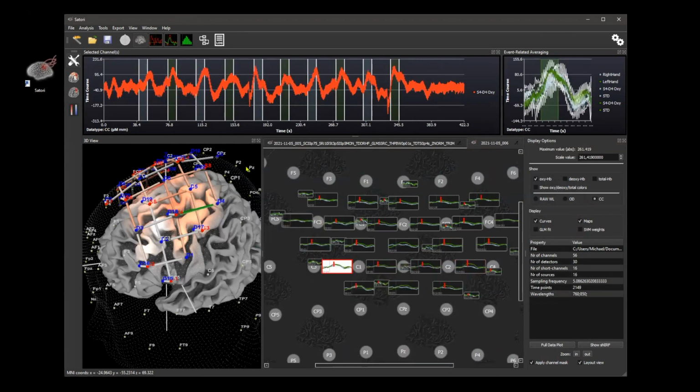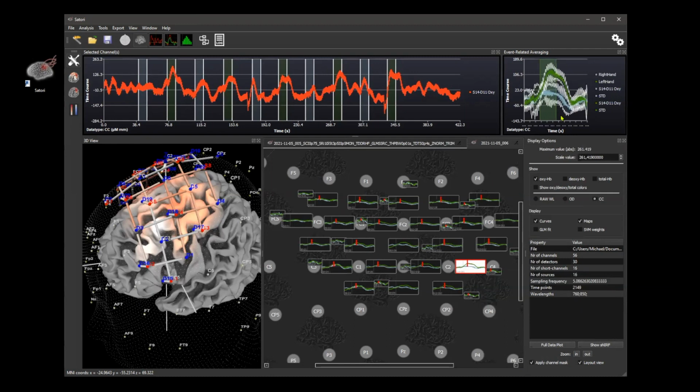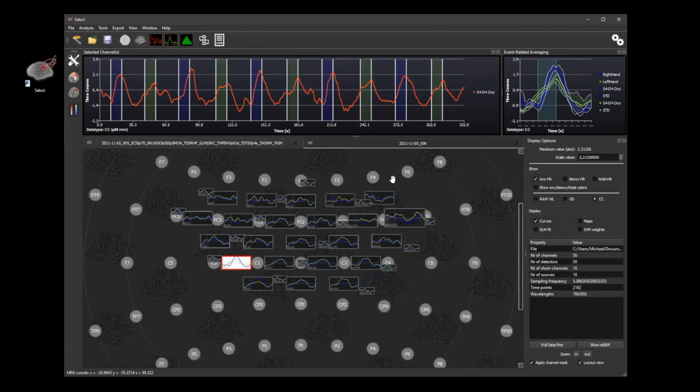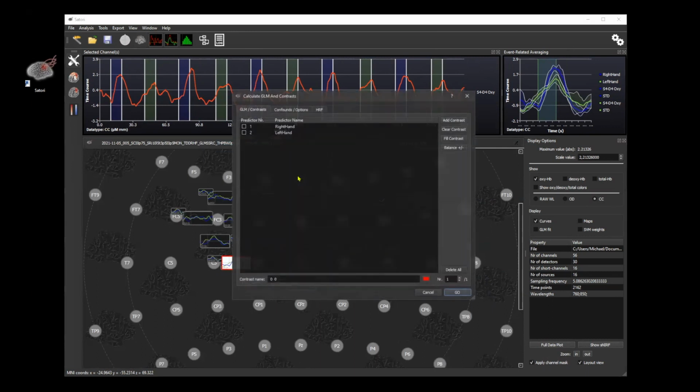And something that we have already seen with the correlation is that we see different patterns depending on the channel. And this we can also see in the amplitude quite nicely. Okay, let's go to our pre-processed data set again, because here we have already done most of the work. To verify what we have seen in the data-driven analysis, in this pre-processed one we can do a GLM, a univariate analysis, on the data.